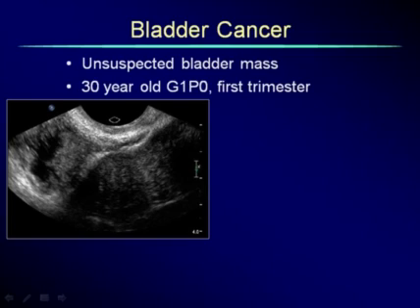Now, another thing that we always teach our sonographers is, when they complete the transvaginal exam, to look around and see if there's anything else going on. Take a peek at the urinary bladder. Is everything okay? I'm not saying to evaluate the bladder. I'm just saying to keep your eyes open for something that could be going on.